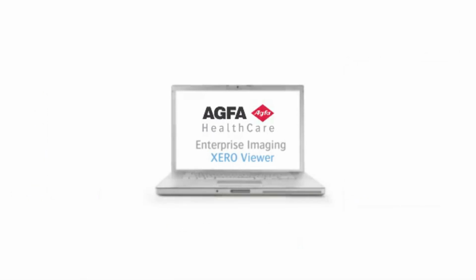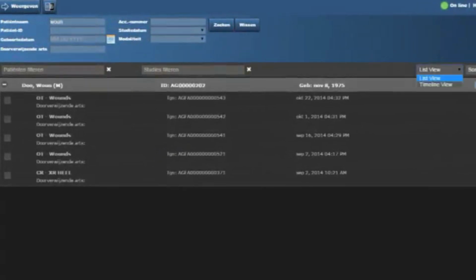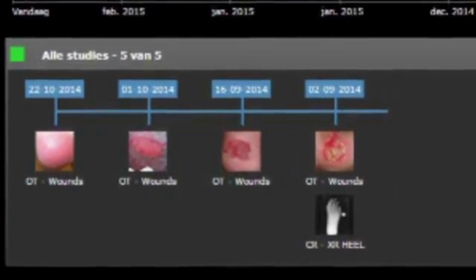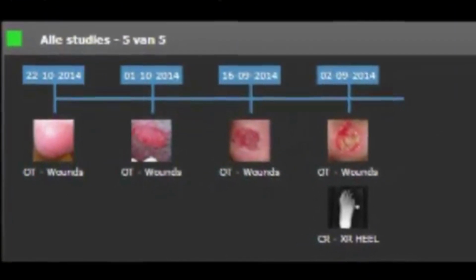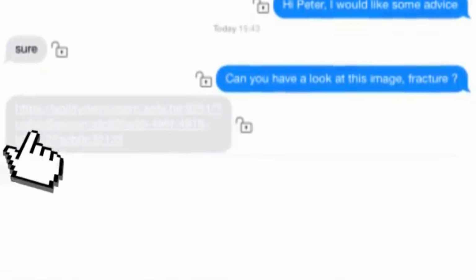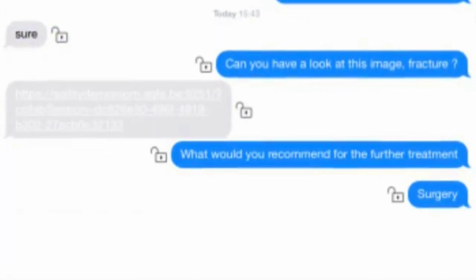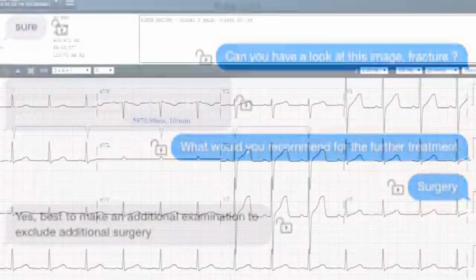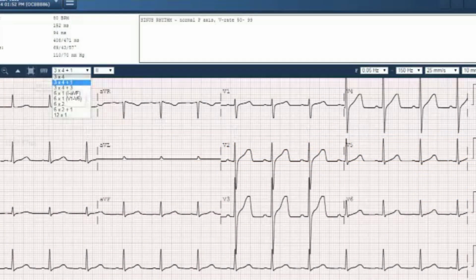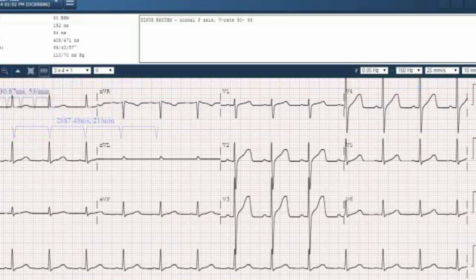Discover some new features today. One example is the new patient-centric interactive timeline. It offers a thumbnail-enabled longitudinal view of all the patient's images, study by study, over time. Chat and share supports communication via instant messaging services so users can share information, send notifications, ask for a second opinion to improve collaboration. Other enhancements include being able to view and interact with DICOM ECG waveforms alongside available reports.